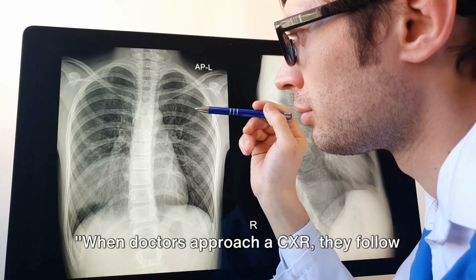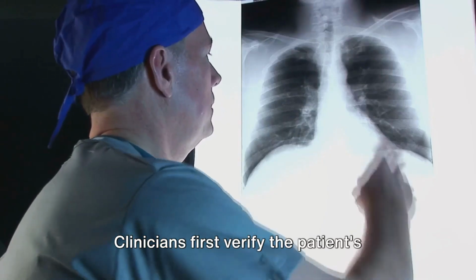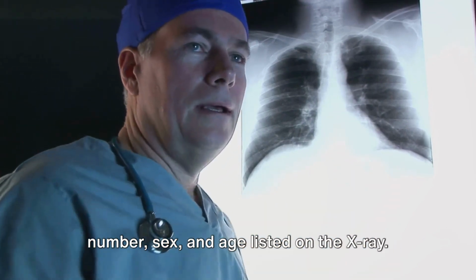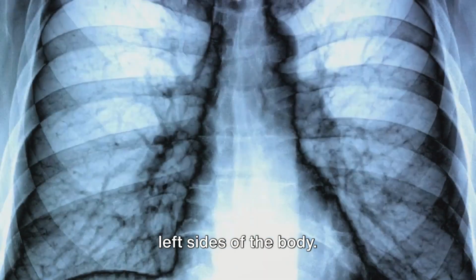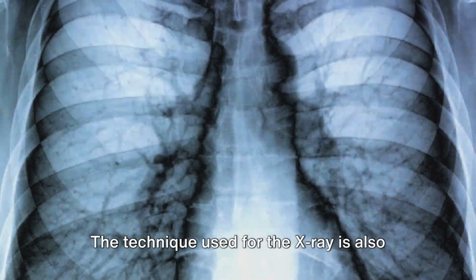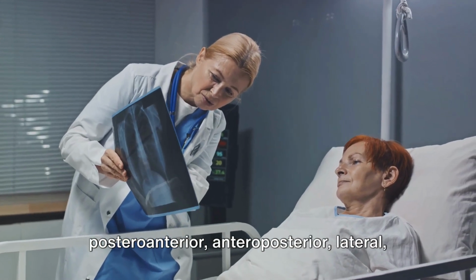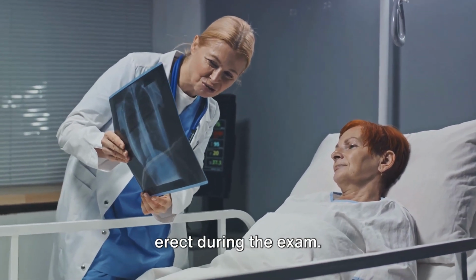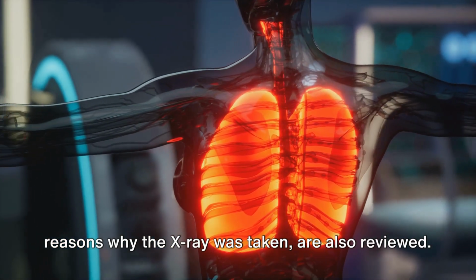When doctors approach a CXR, they follow a structured process to ensure a thorough examination. This process begins with the basics. Clinicians first verify the patient's identity using the name, medical record number, sex and age listed on the X-ray. They then check the date of the exam and look for markers indicating the right and left sides of the body. The technique used for the X-ray is also noted, such as whether the view was posterior-anterior, anterior-posterior, lateral, and whether the patient was supine or erect during the exam. The indications for the study, or the reasons why the X-ray was taken, are also reviewed.